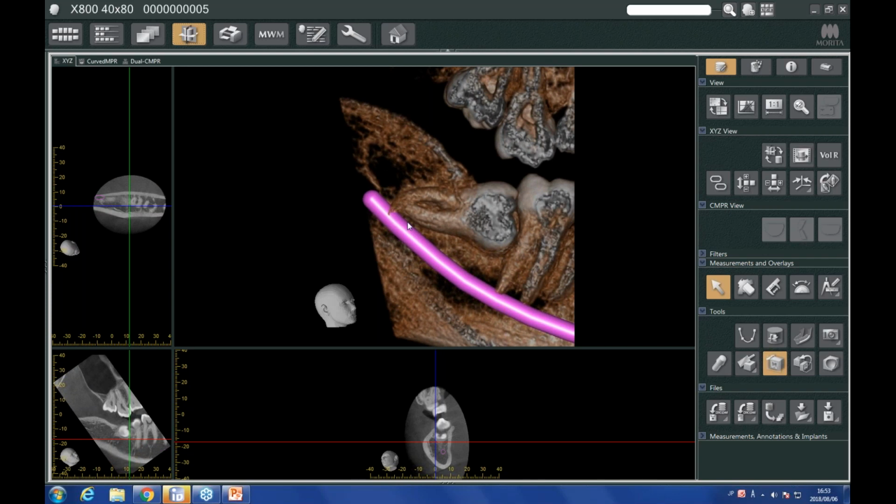So again, this volume rendering along with this dynamic cut is a good way to show the patient why you're choosing a particular treatment, or to encourage them to choose a particular treatment and be very well aware of the risks beforehand. So this basically concludes what I'd like to say for iDixel.